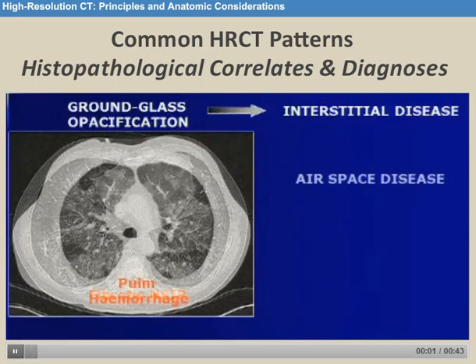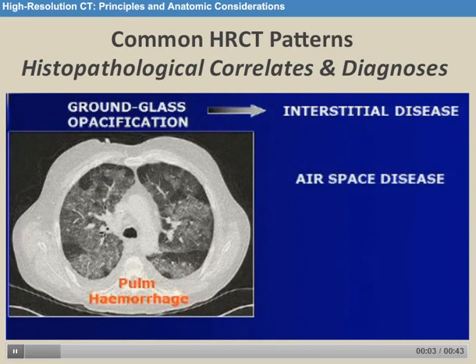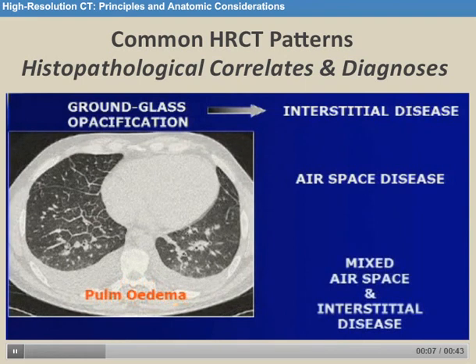Now, ground glass opacification, as you've already heard, is a non-specific radiological sign. At a very basic level, all it means is you've displaced air partially from that region of lung. And that is an absolutely crucial thing to understand. Anything which partially displaces air from the lung will cause an increase in density.